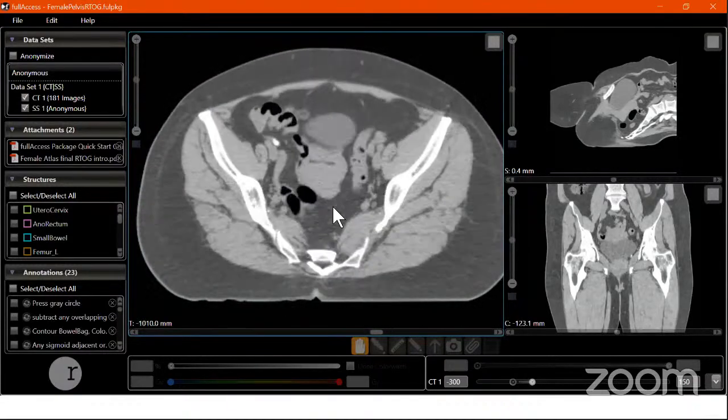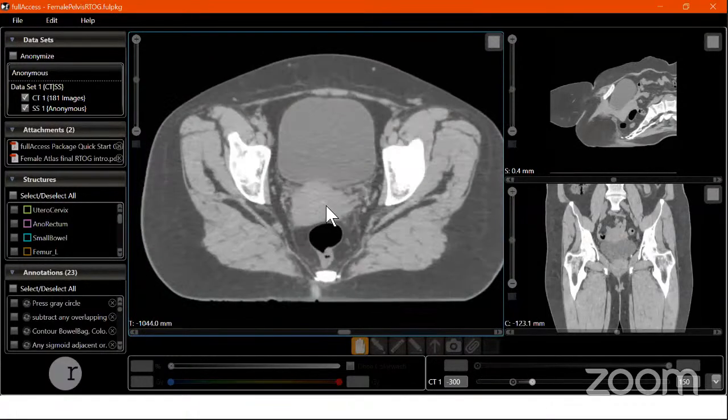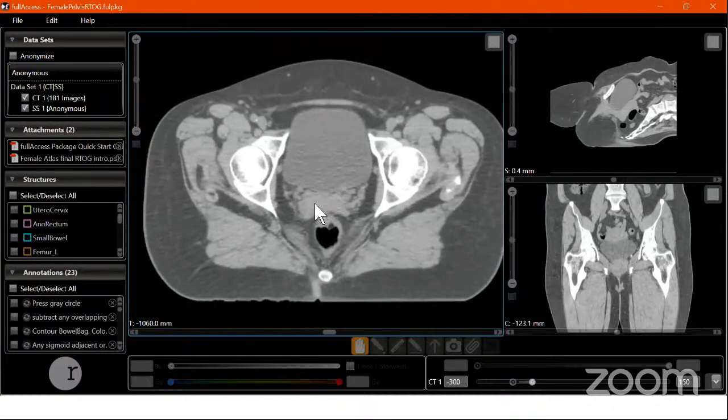Whatever visible disease we see here, this is apparently a normal cervix. As we discussed, when we come down, the flat structure is the vagina, and the round structure is the cervix. A general rule is that the junction of the vagina with the cervix happens right behind the pubic symphysis.